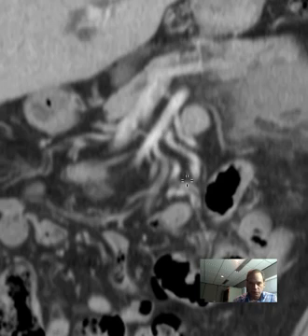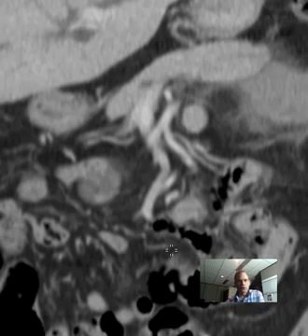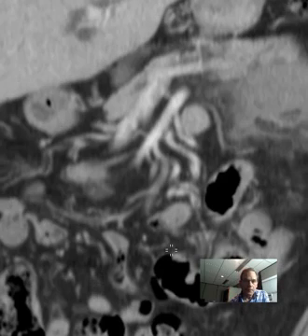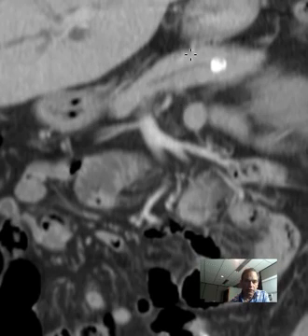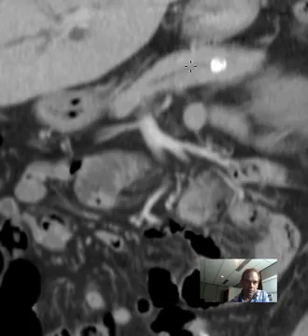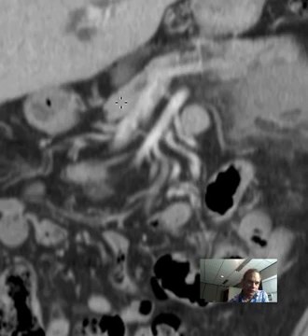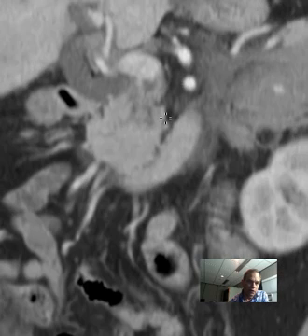And you see these arterial branches going out in the mesentery, the fatty material that is the base of attachment for all of the, or most of the small bowel. Okay, and what do we have here? That should be pancreas. Yeah, this is body of the pancreas. Have a calcification there. And let's see if we follow it right here. It should get embraced by the C-loop of the duodenum, and indeed it does.